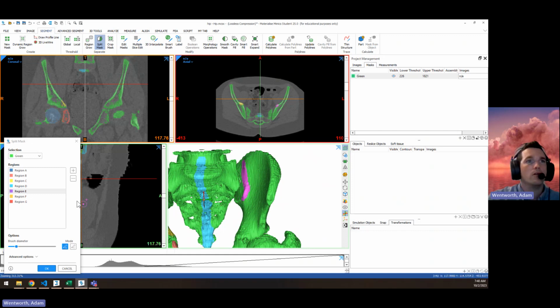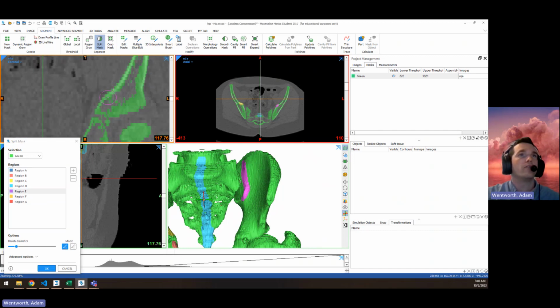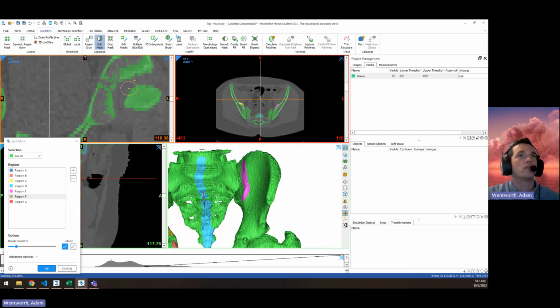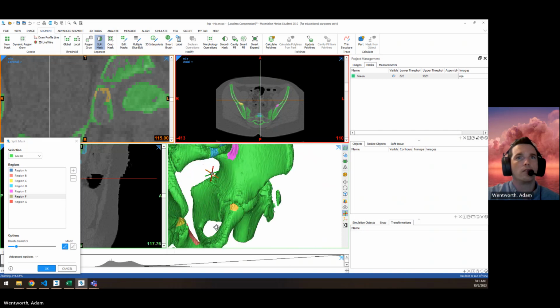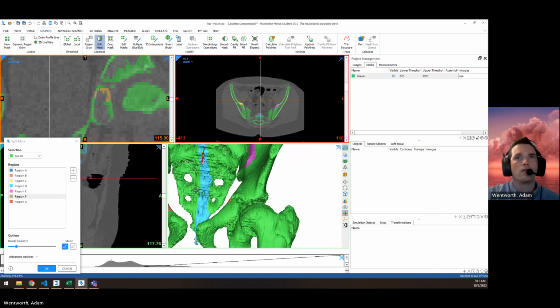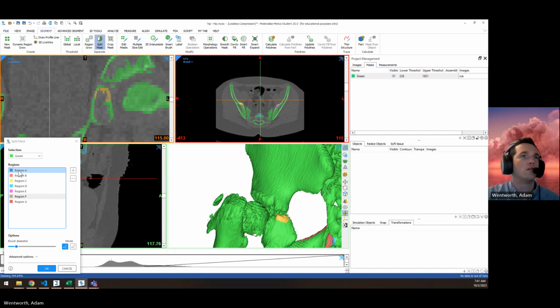So it's really important, if we have masks that are touching or very close to touching other pieces, that we identify those edges in this. So you can see between these two fracture points, the mask can touch in a couple places. So we just make sure that it's differentiated with that brush. And our last one is this femur.